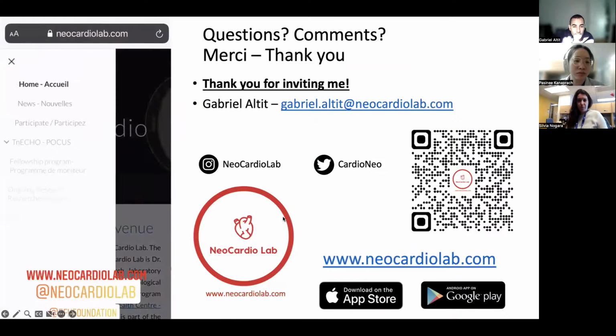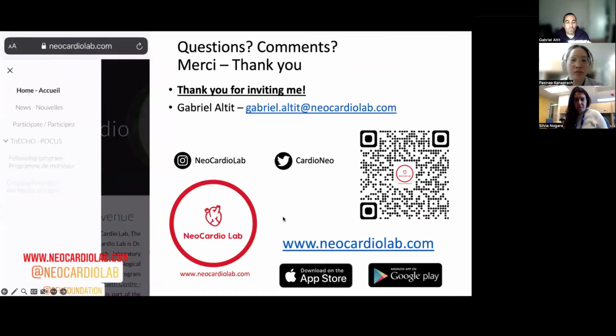So that's it for this presentation. That's an overview of the different echo metrics that we could use, and how we do some of these measurements.